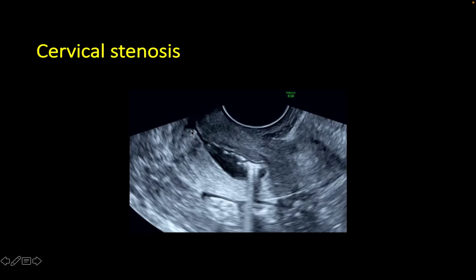And this made me think of cervical stenosis at this level, because what was actually happening was that the menstrual blood was getting pulled up at this level, and in the intermenstrual period, she would keep discharging this pooled blood. That is why she was having this irregular bleeding or spotting for the last almost 2 years. All that we suggested, since it was a case of cervical stenosis, was to do some dilatation at this level, which the patient underwent, and her symptoms were miraculously resolved.